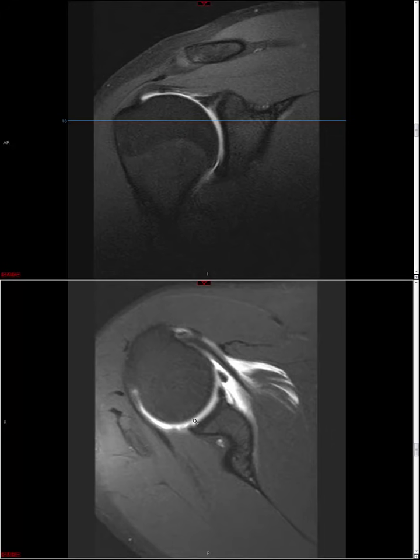If we see some thinning but not full thickness thinning, then we're dealing with moderate chondrosis, or grade 2 or grade 3 if you like to number these. I might call it grade 2 if it's less than 50% of the thickness. If it's more than 50% thickness, I might call it grade 3. And then if we see secondary bone changes, cyst formation or edema, then that's a good indication that we have full thickness cartilage denuding, and I would call that grade 4 or severe chondrosis.